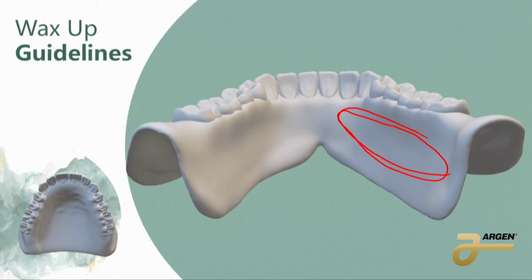I know sometimes in school they're going to teach us this little S here. Should look like an S. And why we're doing that is basically because we're making room for the tongue here. So we're thinning it out there all the way along, and that's what gives you that S shape. So if it has to look like an S, and you ask why, and they don't know, it's because you need room for the tongue there.